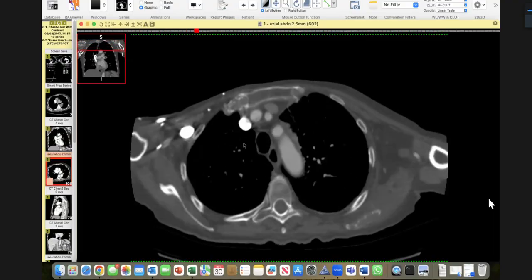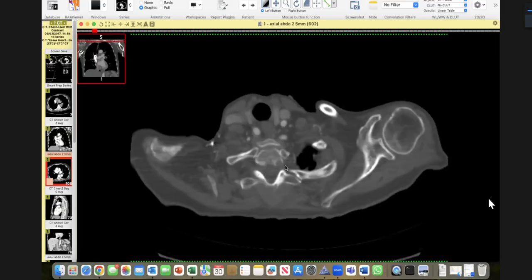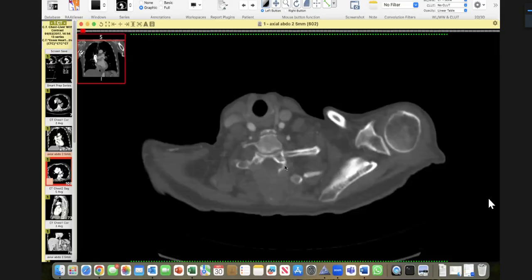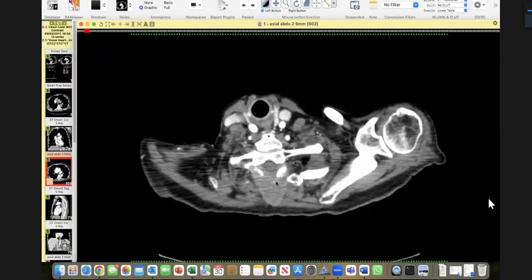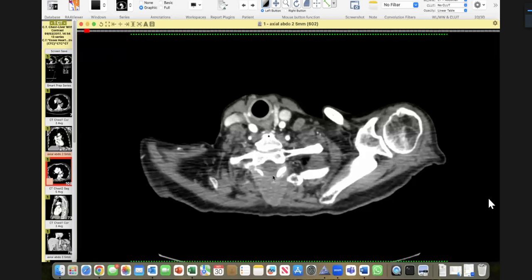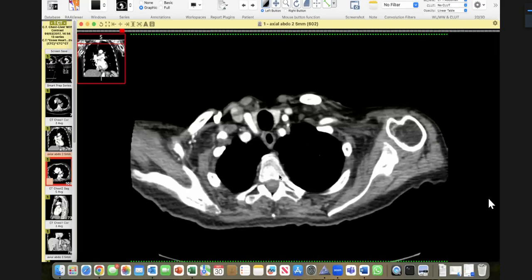And one of the key findings is that the spine is involved. And this was the edge of the film. You see, I am going up, and this is the type of case in which the clinically most significant finding might be at the last cut. So at that cut, if you see, there is metastasis sitting here, and I wanted you to pick that up. Why? Because even if this patient has metastatic disease, this requires an urgent MR for the simple reason that cord compression, even in a palliative case, you have to treat it and things like that.